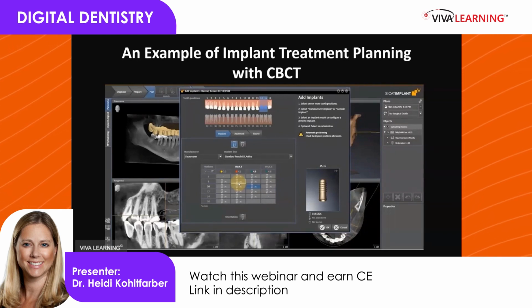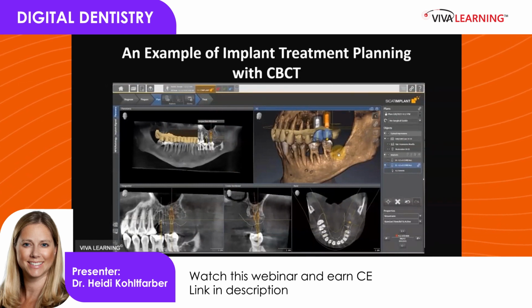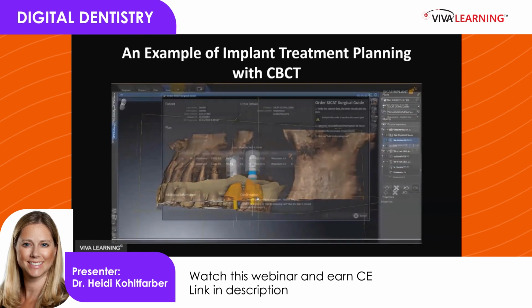Whatever it is that's your favorite will probably be in there. You can go ahead and pick that, and you can just try it in and figure out your axis of orientation, where you'd like to put that in relationship to any of the pertinent anatomy, and come up with your entire treatment plan.